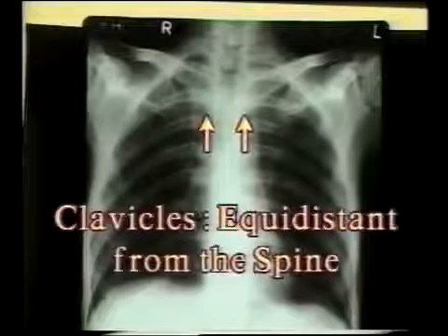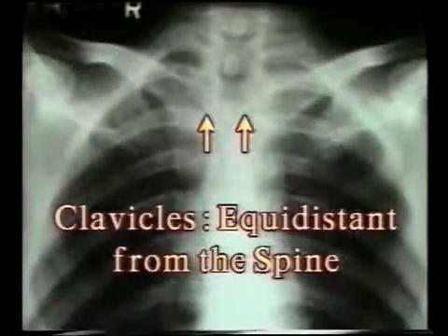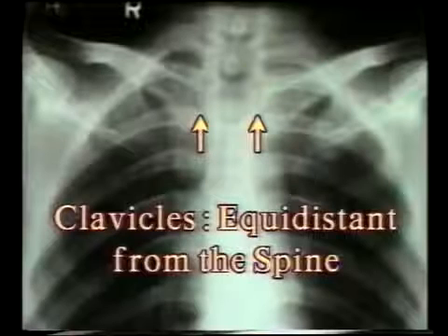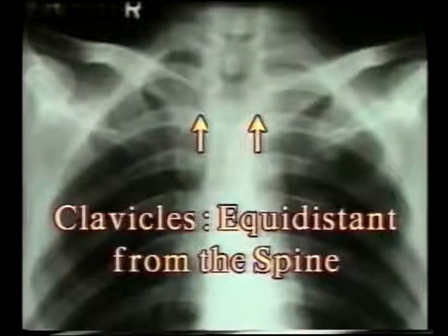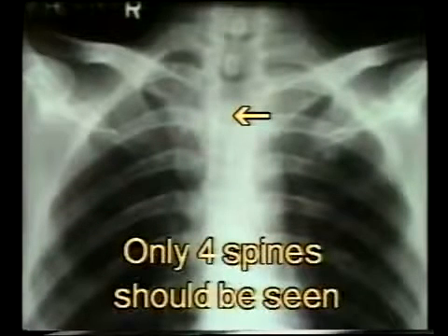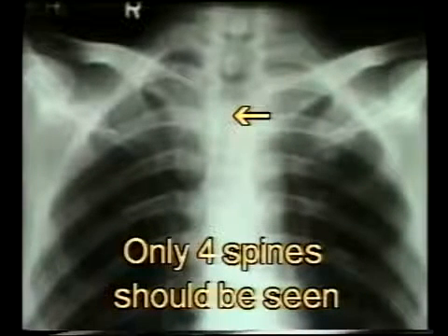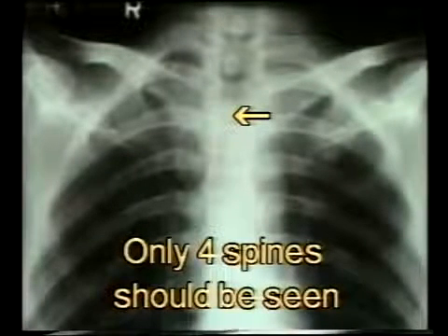In a well centralized film, the medial ends of both clavicles are equidistant from the spine. If they are not, then you cannot make any comment on the mediastinal shift, cardiomegaly, or on comparative radiolucency of the lung fields. In a well exposed film, the spinous processes of only the first four thoracic vertebrae are seen. Others are hidden by the heart shadow. If the film is overexposed, more vertebrae are seen and the lungs appear more translucent.